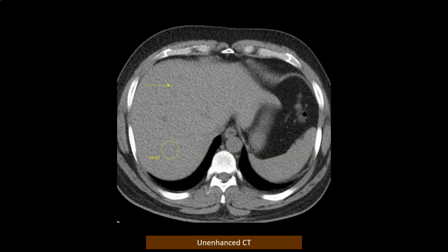The arrow points to the site of the lesion, as we will know from subsequent imaging studies, but the finding against the fatty liver, which was seen on ultrasonography, was that the Hounsfield unit value of the liver parenchyma has been 54 Hounsfield units. What to do next? The nephrologist refrained from doing gadolinium-enhanced MRI, so it was decided that PET-CT may be a good way to know if we are having significant focal liver lesions or not.